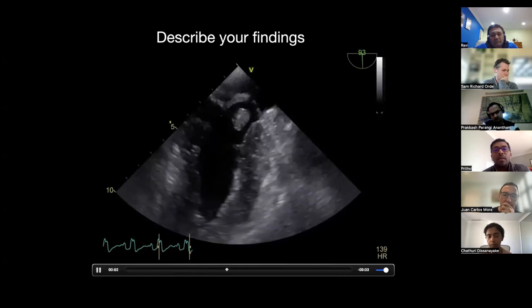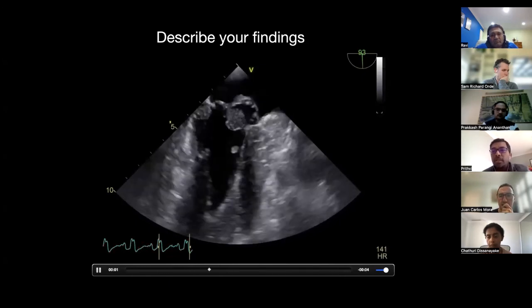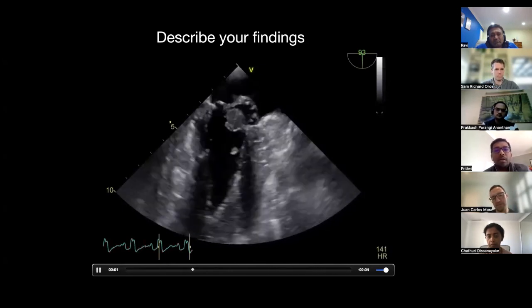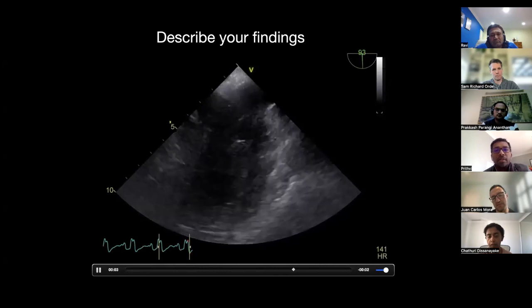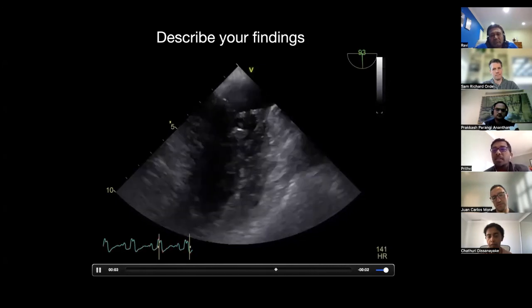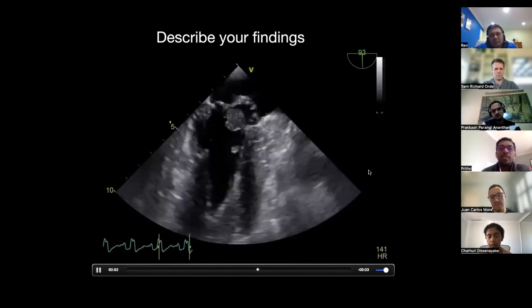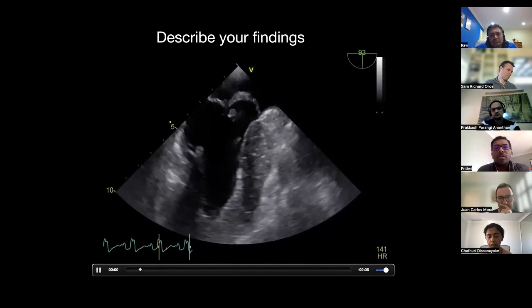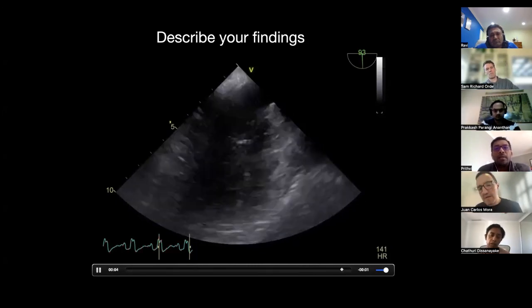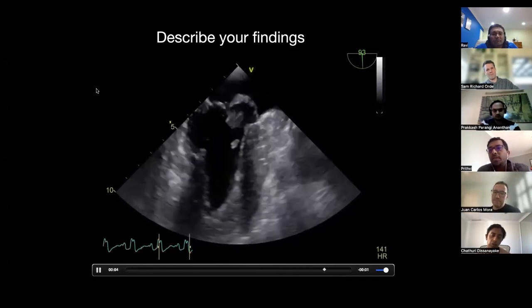And the fact that the IABP was inserted in angiography suggests that that could have been possibly for post-coronary revascularization, but also for potentially a severe MR. So I would like to look at this in other views and apply a color Doppler across the mitral valve to see if there is a significant regurgitation.